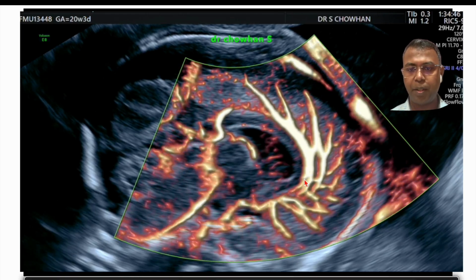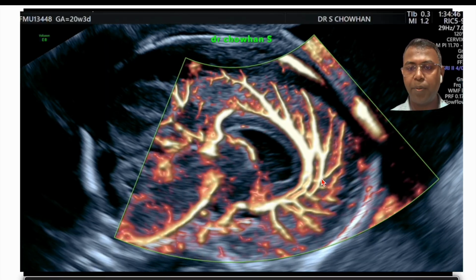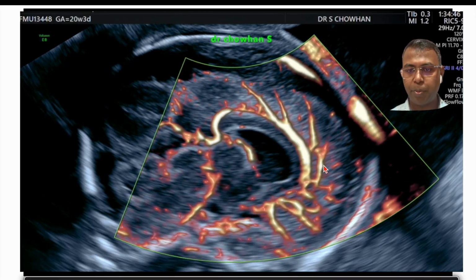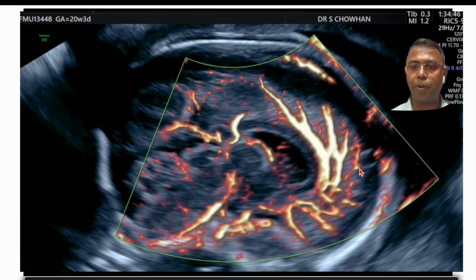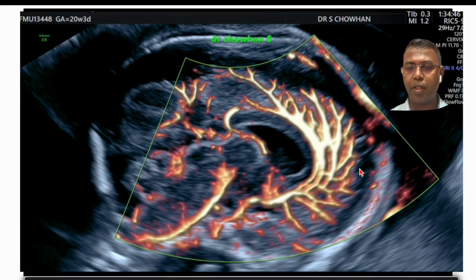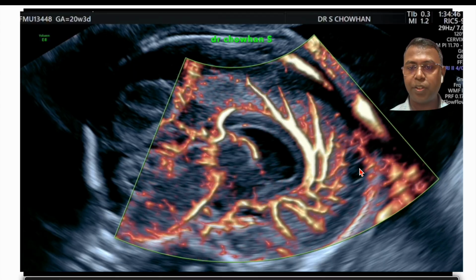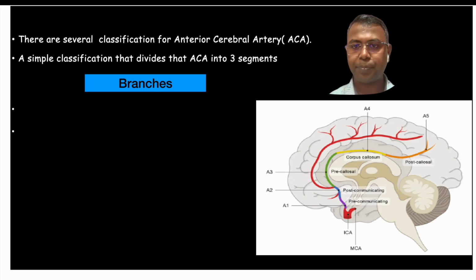This is the Peri Callosal artery, we all know about it, but we really don't know about these branches, so many branches which are coming up. Today in this video I am going to talk on these branches, what the names of these branches are and what variations can exist in such cases. In this still image, you can see the Peri Callosal artery and a lot of branches.